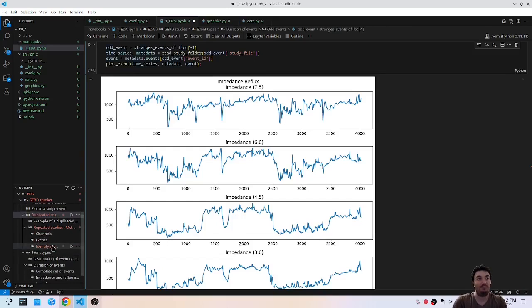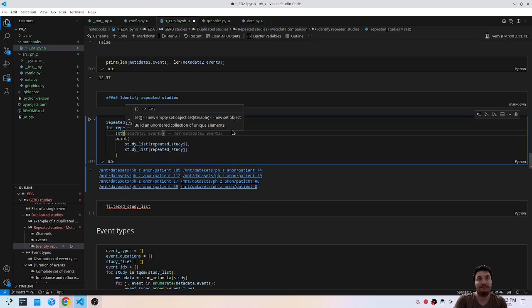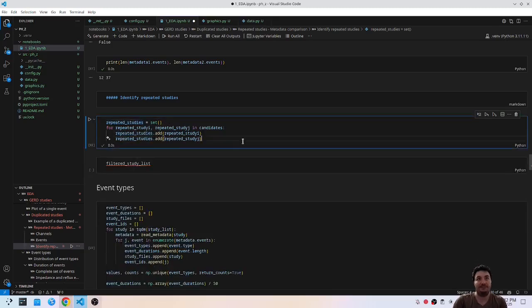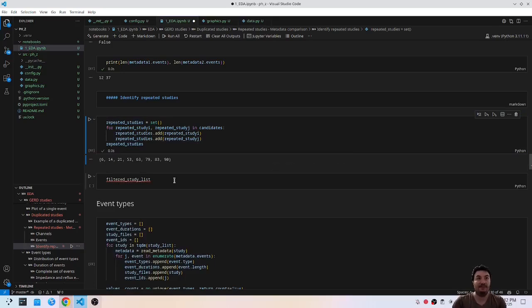Oh well. No. We started add Y, add J. We can print them. Okay, study list.